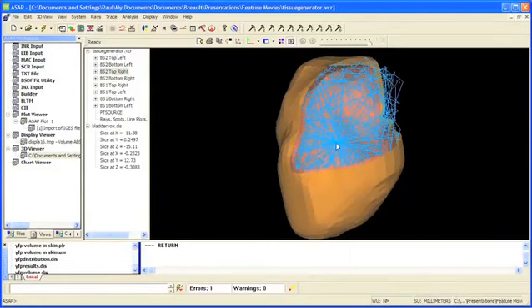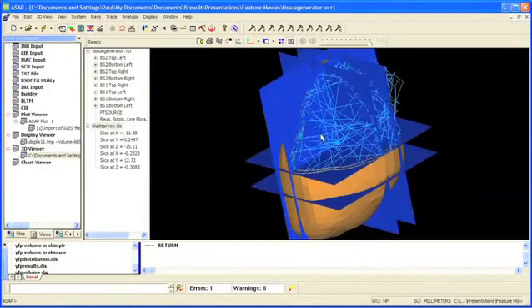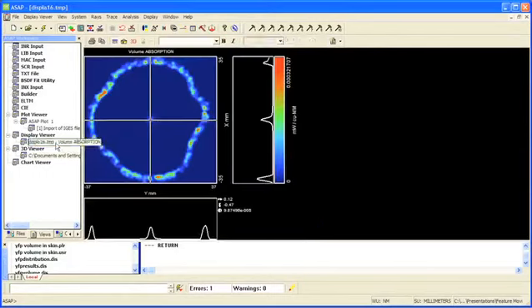As you can see, we have an isotropic point source that is propagating through a saline solution inside the bladder, and scattering is occurring within the wall of the bladder. And we can visualize this using our voxel system. We can actually see absorption in the medial, sagittal, and transverse planes. We can visualize this as well as a single slice through the center of the bladder.